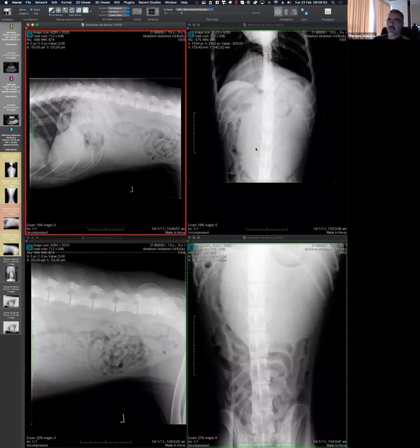Why is it that we invented the term mass effect? Why are we not brave enough to call it a mass? In that situation it is because we don't see the borders. Makes sense? Because we see the consequence of a mass, but we don't see the actual borders. So that is kind of a defensive attitude, to say, well, I don't see the mass, but there is something acting like a mass. So if we go by that definition, then Catherine, your argument doesn't really fit, because you are using our ability to see the borders to defend the fluid, when with mass effect, we don't see the borders in any way. But again, this is semantic.